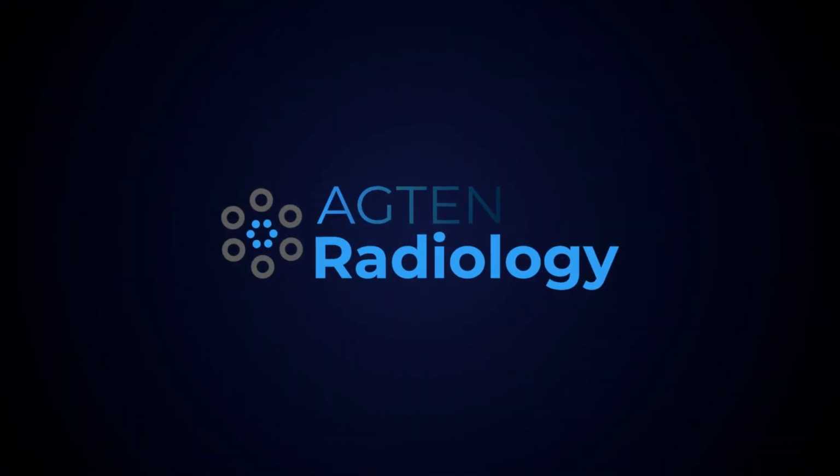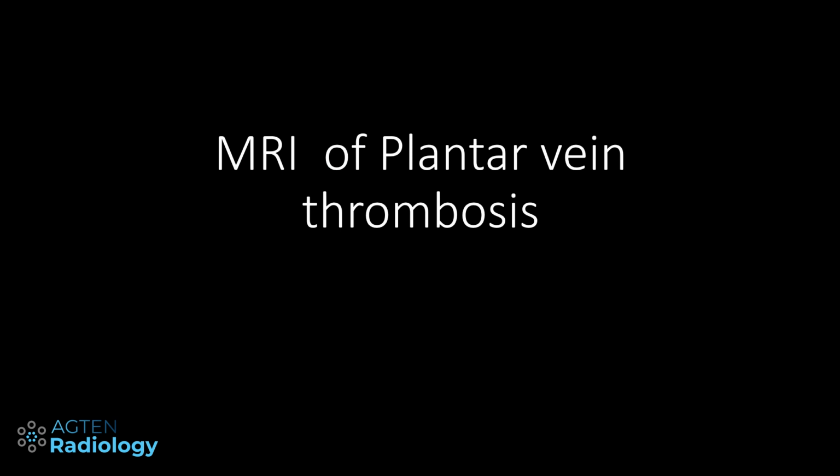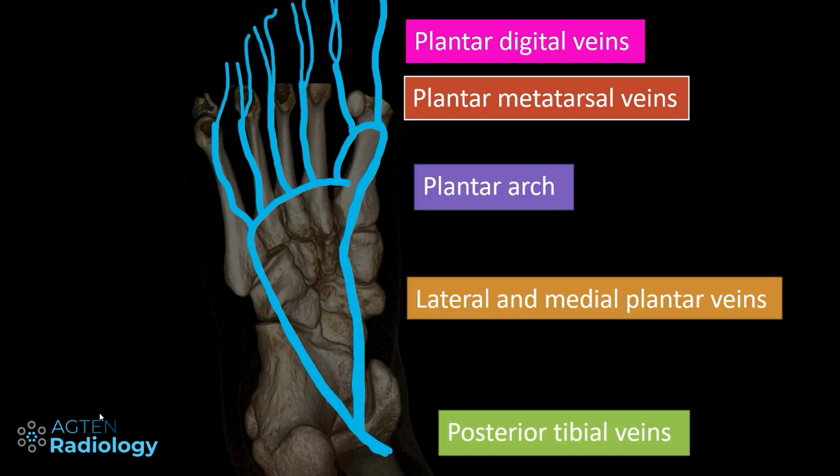Now, for the plantar vein thrombosis, let's jump right in. Okay, so let's start first with the relevant anatomy of the plantar veins, because we need to know the anatomy in order to describe where we are actually seeing something that looks like a thrombosis.